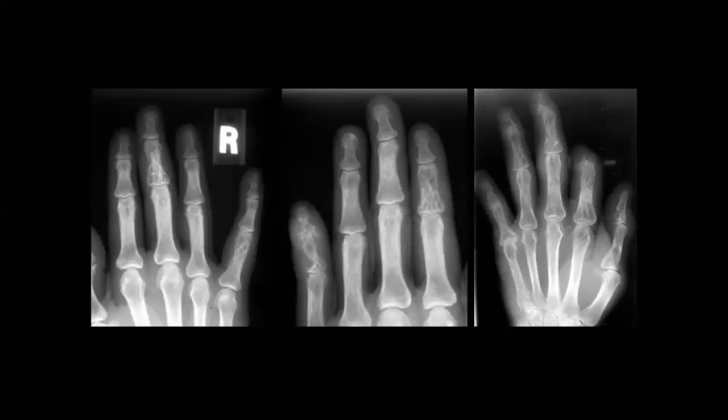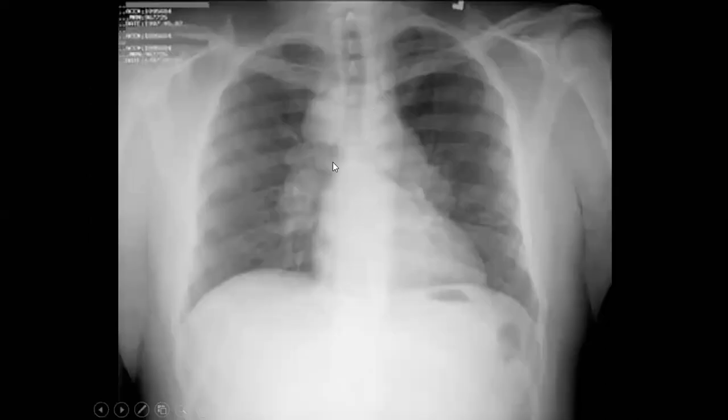Maybe this lace-like or trabecular appearance is suggestive of something like this. But you should put other differentials, including other things that can make multiple lytic areas. When you have this appearance with bilateral hilar lymphadenopathy and paratracheal opacity, you are talking about sarcoidosis.